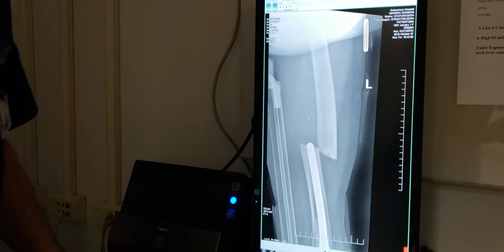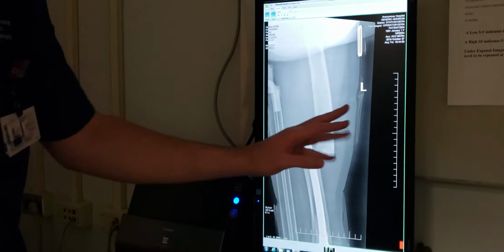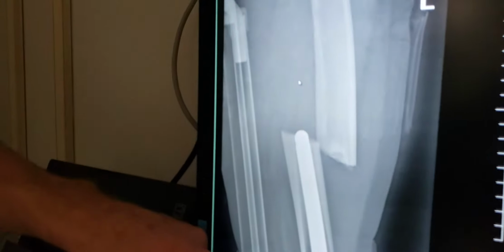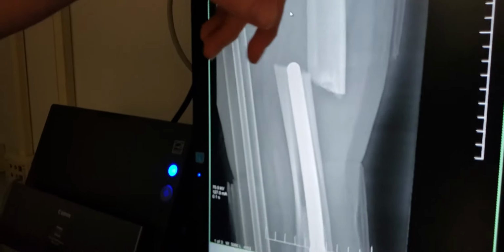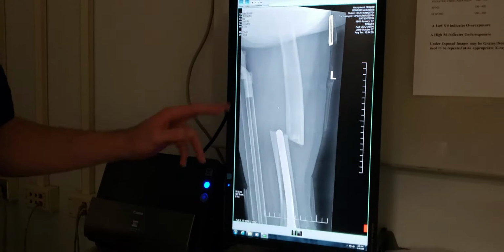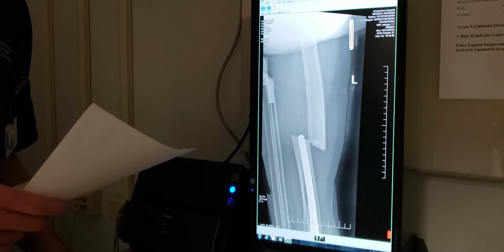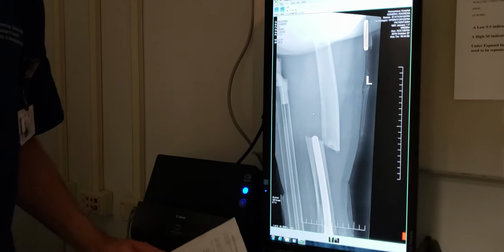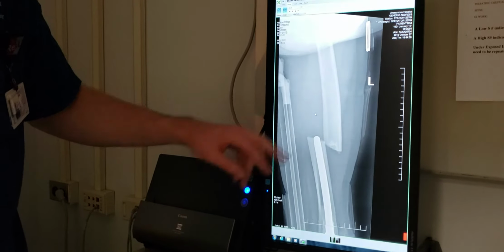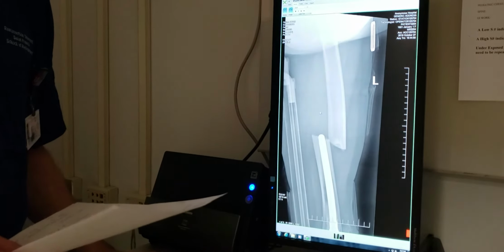There are a few things in the image, but nothing is obscuring this very clear fracture here. There's the bands here. It's kind of hard to see, but there are striations across the image and along here. The marker's almost in the soft tissue. The clip is way out of the way, but also in there, as well as the immobilizer that's connected to the straps. For this image, the tech centered mid-shaft and right about here, right on top of the fracture almost, but didn't quite drop it down all the way to include the joint there.